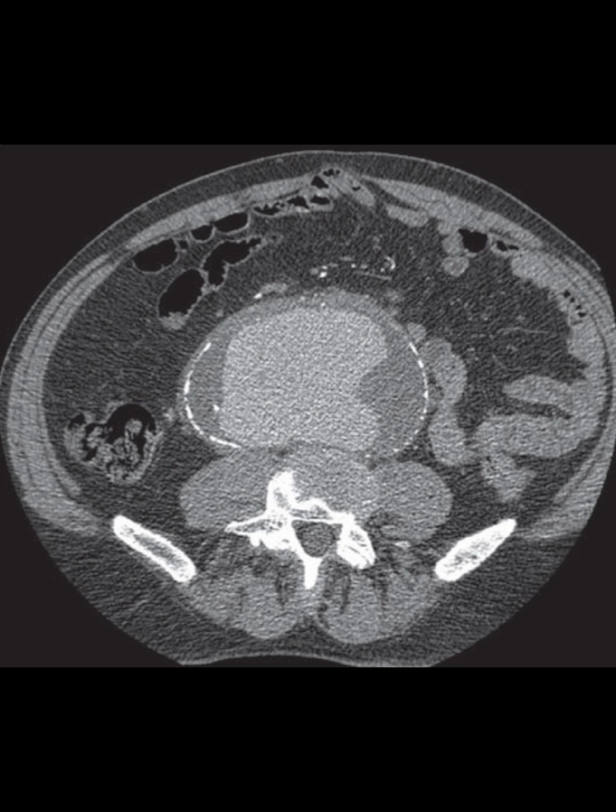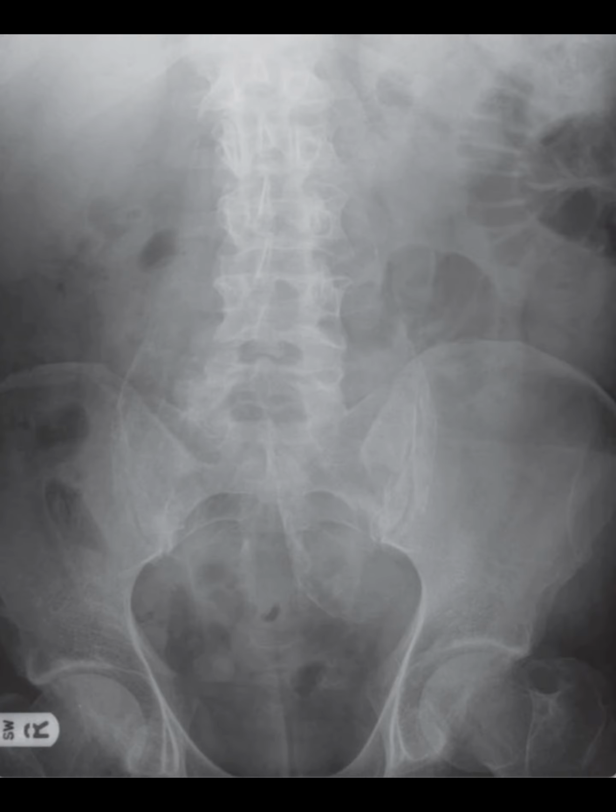To further confirm the presence of an aneurysm, I also review a CT scan of the abdomen, which in this case confirms the presence of a very large aortic aneurysm. The CT image clearly shows a dilated aorta with well-defined calcifications along the vessel wall. While there are no signs of rupture on this scan, this is a critical finding that requires prompt attention. I would again collaborate with the referring clinician to discuss potential treatment options and formulate a management plan, including possible surgical intervention.